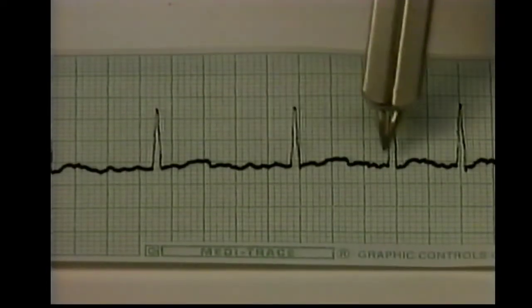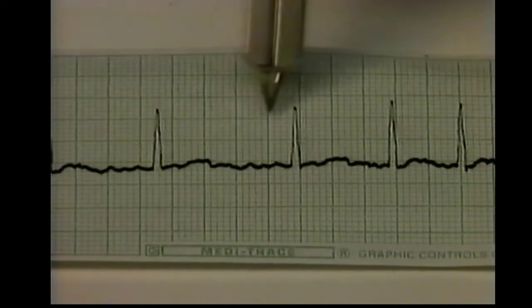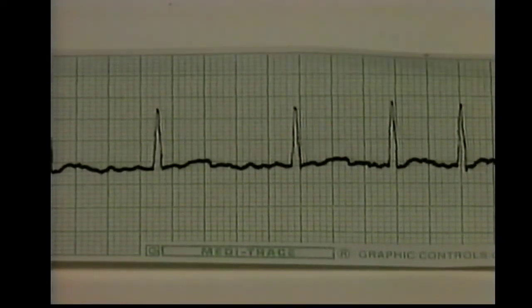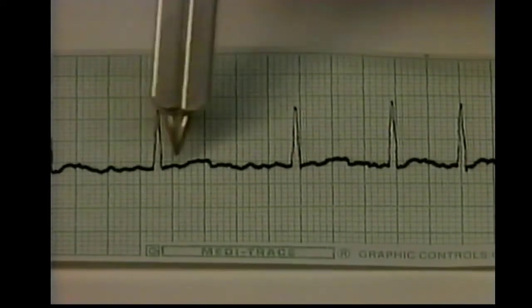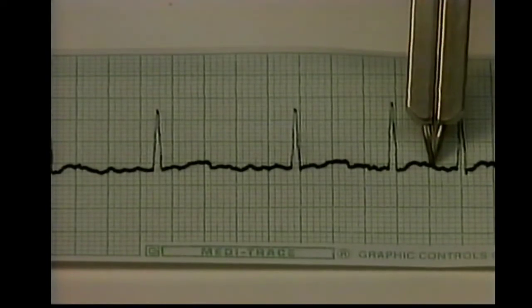A typical upright P wave is not present. Although narrow QRS complexes are seen, a P-QRS relationship cannot be established. Some discernible F waves are seen. They vary in size and shape and have an irregular rhythm. Consequently, an atrial rhythm and rate cannot be measured. The PR interval also cannot be measured.